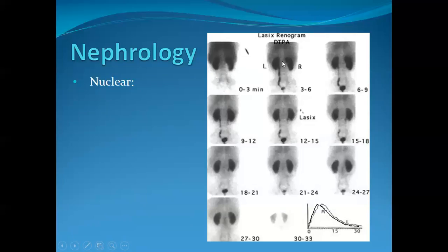So you can get a ton of information from this evaluation. You can see the size of the kidneys are similar. You can see the positioning of the kidneys are similar. All those are important tools, important information that you can get. And remember, our kidneys can not only be in different locations. You can have pelvic kidneys. If you want to go back to your embryology, your kidneys originate at the mesodermal ridges, kind of in the pelvis, and they migrate upward to their normal location. So anywhere along that migration track, these kidneys can potentially be, and that's why we'll have pelvic kidneys. You can have one kidney. You can have more than one kidney.